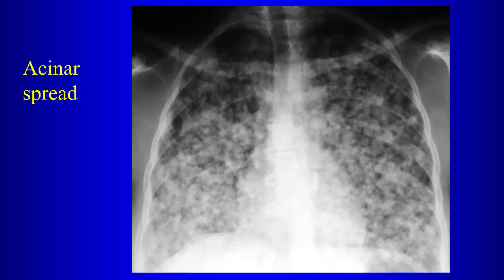Bronchopneumonia, right? This represents airway dissemination of a process. So bronchopneumonia, especially from bronchogenic dissemination of tuberculosis. Okay? So bronchogenic dissemination of tuberculosis can also look just like this. So if you think of bronchogenic dissemination when we see something like this, you think of pneumonia.